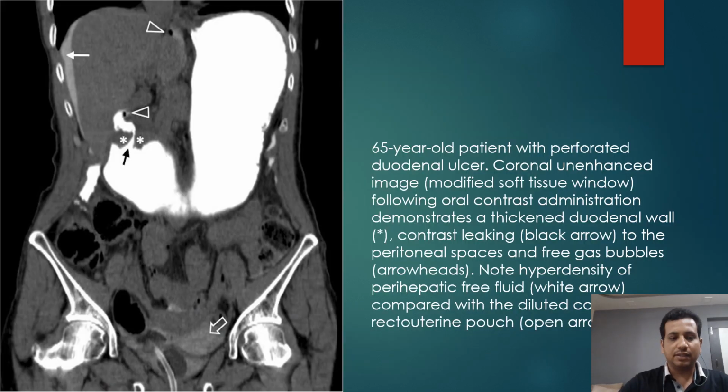Next, as you can see here, oral contrast was given, and there is a leak of contrast at the site of perforation. This contrast is seen going into the subdiaphragmatic space, and it is also seen in the pelvis, in a lighter shade because of dilution of the contrast.